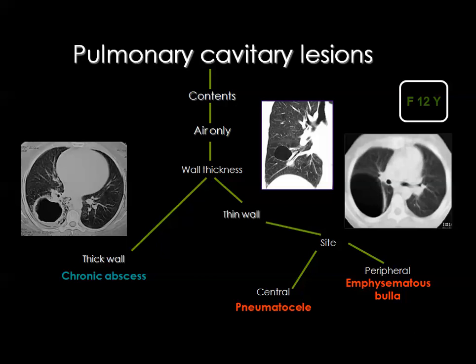And you remember we have four focal pulmonary lesions: the nodules, we have finished; the masses, we have finished; also the patches, we have finished; and now we are left with the cavities. And I have mentioned that the cavity is an air containing lesion, well defined, and it may contain an air fluid level or may contain air and mass, but air is an essential feature for the diagnosis of a cavity.